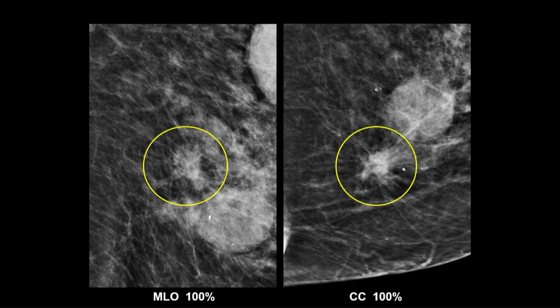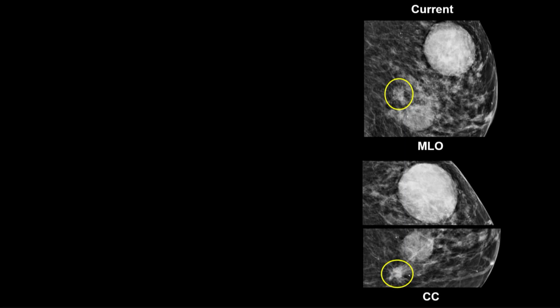Often the thing you see first is not the important thing, because cancers are indistinct, but circumscribed masses are usually benign. So you're going to see the circumscribed mass first. Calcifications that are benign or coarse, you're going to see them before you see the tiny little ones that are cancer. So keep that in mind. Once you perceive this, the workup is pretty straightforward.